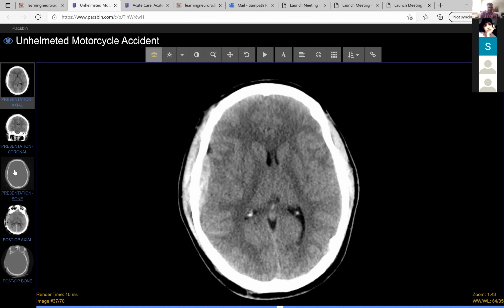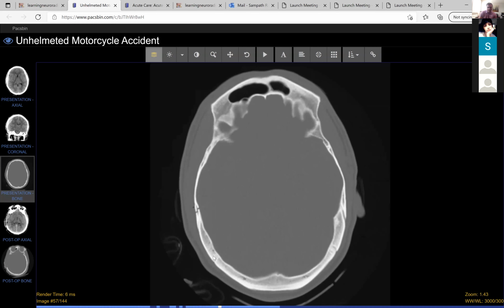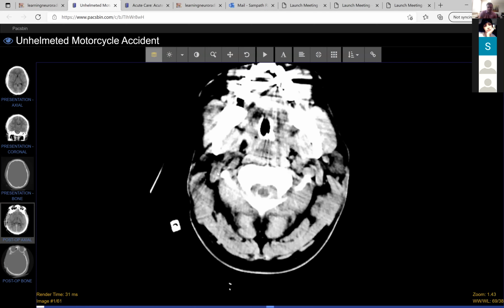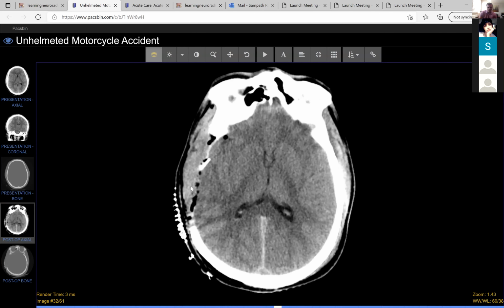And so this patient needs immediate care in terms of surgery. You can see how he probably has a fracture right there. You can see a calvarial fracture in the right parietal bone, and that probably caused a direct impact on his middle meningeal artery, which causes this bleed. So here they have to take the patient in and do surgical evacuation. They have to do a craniectomy, so they have to take a portion of the skull out.